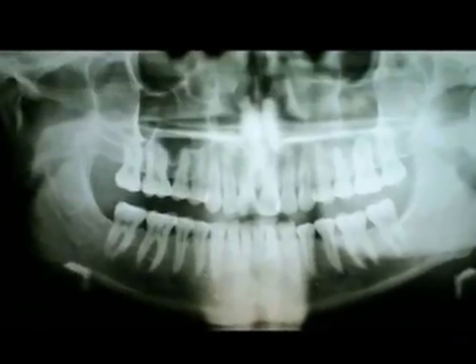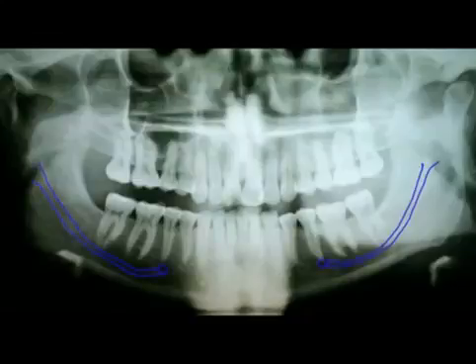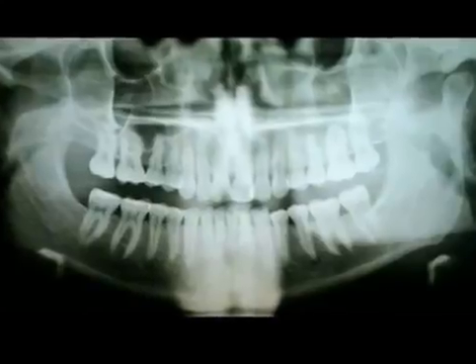Let us forget about the joint for now and take a look at the lower jaw. You can recognize the teeth, and if you take a good look, you can see a dark strip running almost the whole length of the lower jaw. Dark means that the X-rays go through, so this area has less bone. It contains a nerve in a hollow bone canal. This nerve gives the lower jaw feeling, and when the dentist gives you a shot and your lip starts to feel numb, it is this nerve which goes lame. You can see where the nerve leaves the lower jaw. From this opening on, it runs under the lower jaw and splits up into many small canals.